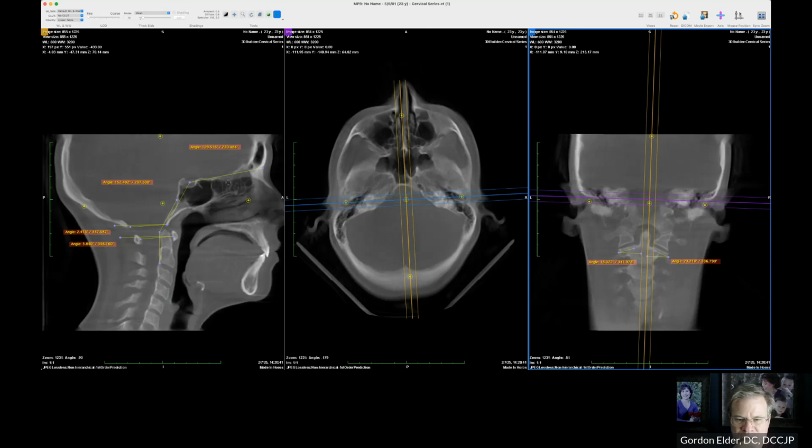The next thing we need to do, well, probably one of the few things that I do in the very beginning is putting it on the 3 millimeters. I scroll back and forth through everything to be able to write down any pathology that I find. And we didn't do that in this particular tutorial. However, I would expect that everybody would do that.